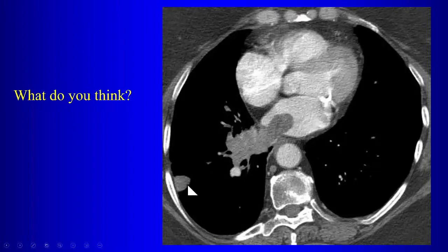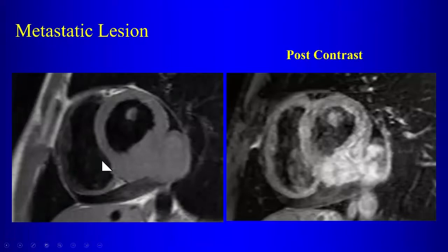And here's another focus of tumor. So lung cancer can invade the left atrium, either growing around the pulmonary veins or directly through the pulmonary veins. So that's another consideration for a left atrial tumor. On echocardiography, they will see this and then diagnose the left atrial mass. Obviously, they won't see the lung cancer. So you may be the first one on your imaging study to diagnose that this is lung cancer that is invading into the left atrium rather than a primary tumor of the atrium.